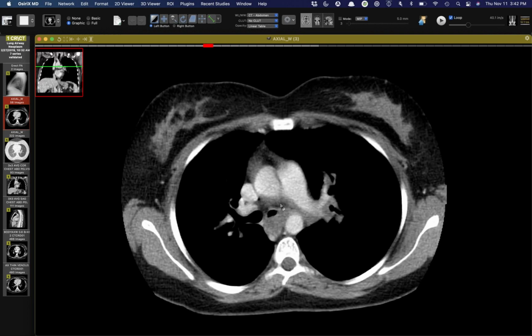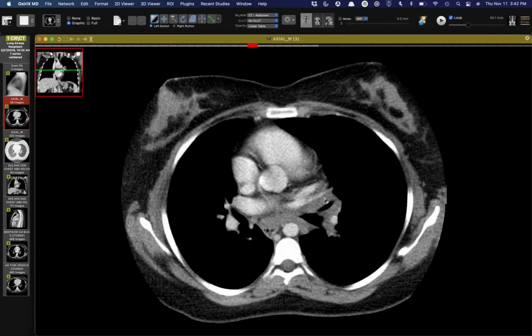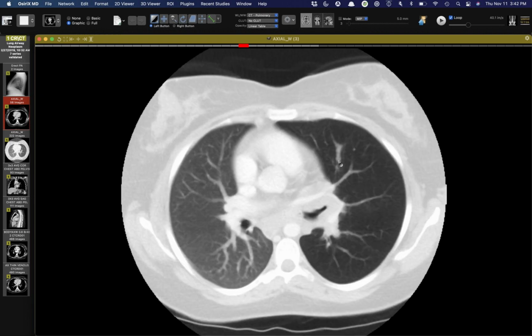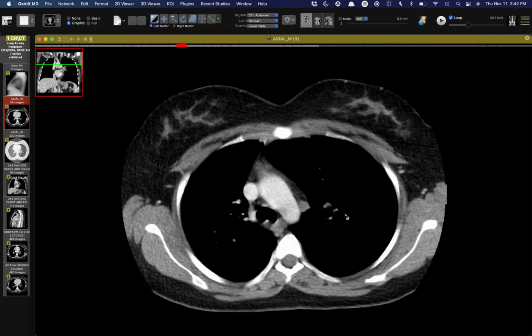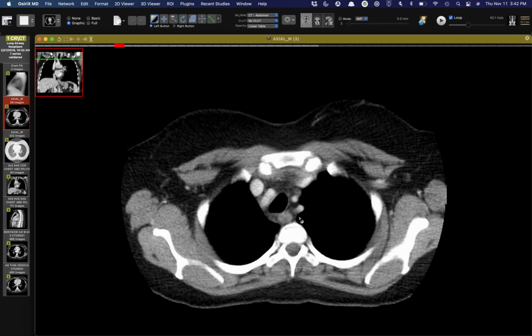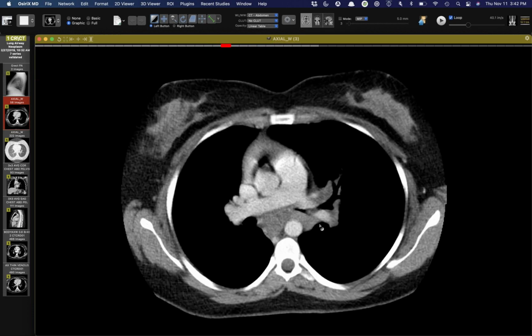So you can see that there's this soft tissue that is infiltrating and extending from the subcarinal space and left main stem bronchus out along the airways in the left lung. I'll show you a more recent study here, but you can see it's extending along the airways. I'm withholding a piece of history that's key, but a clue to the diagnosis is the presence of this abnormality as well. Does anybody want to take a guess of what this entity is and what this patient's underlying diagnosis is?